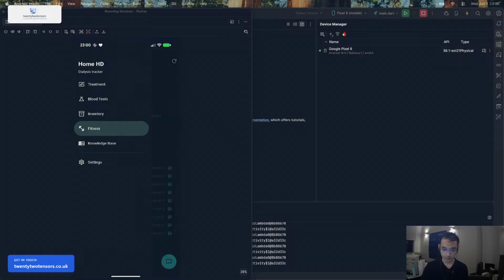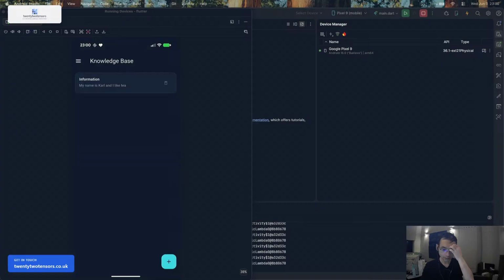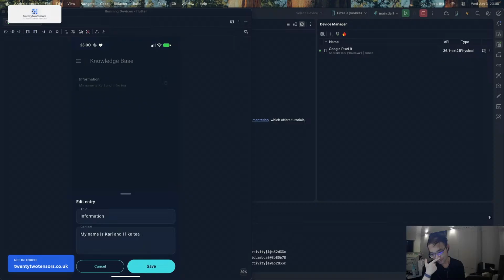And the next step is the knowledge base. Basically, what I did here is a custom context for my chatbot, like emergent basic information: how I like to communicate, and some basic information like what my disease is called, how my setup is, any information that will help with the analysis of the treatment and the monthly blood test.